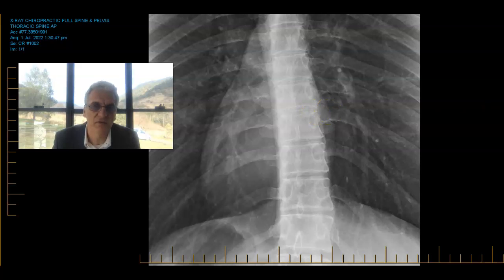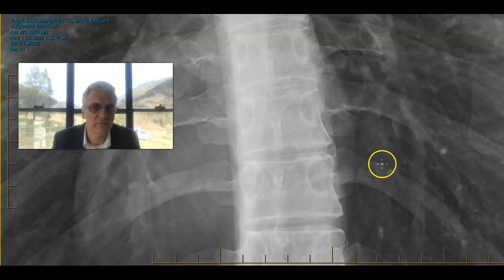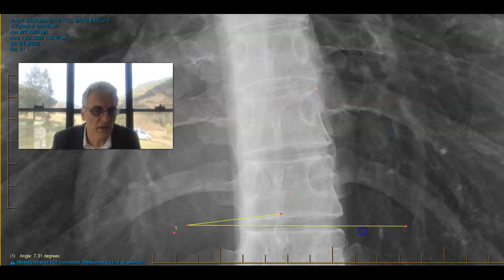Oh, and we'll enlarge firstly, just to get some magnification helping out. Bring that vertebra back into play. Now, I don't know what my horizontal is just yet, but that's why this line down the bottom becomes very important.